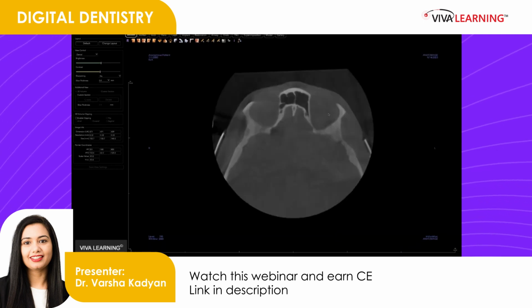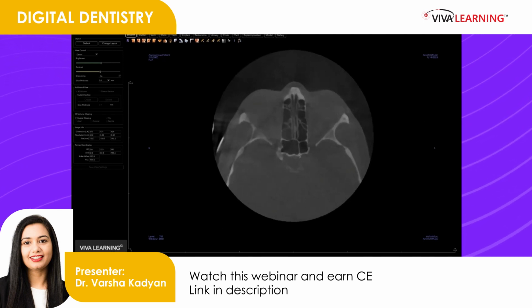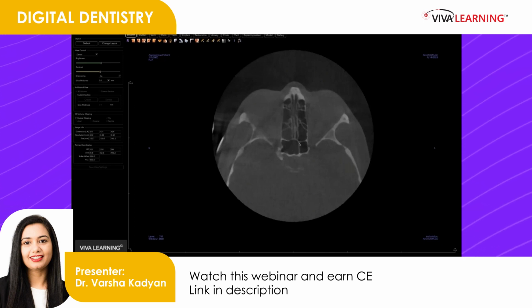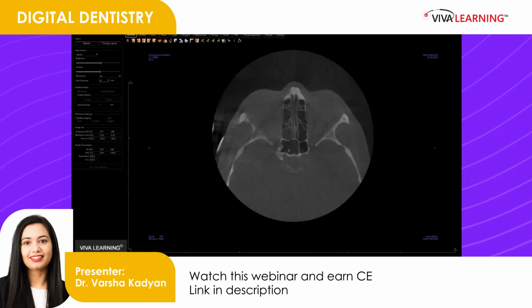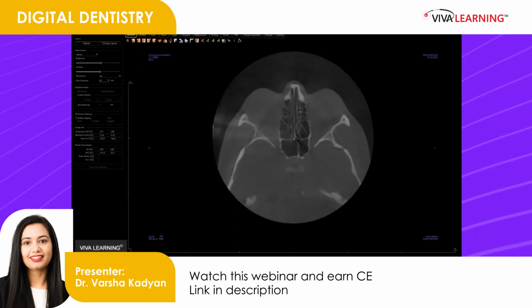Frontal sinuses, orbits here bilaterally. This is the ethmoidal sinus area. These are 2 sphenoid sinuses, and the sphenoid sinuses are often divided by a bony septa, and usually one of the sphenoid sinuses is bigger than the other. In this case, the right one is bigger than the left one. And this is the sella turcica.